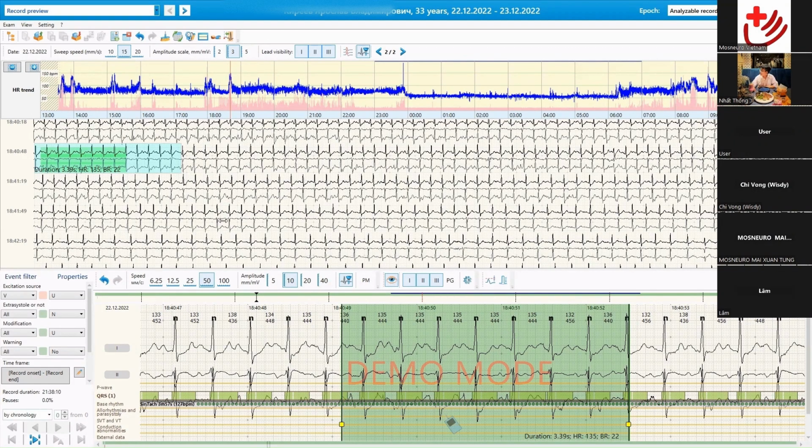And again, a remark on how you can work with the software: if you see something interesting, you do not wait for another step of the analysis, just put this part in the report and use it for diagnosis.